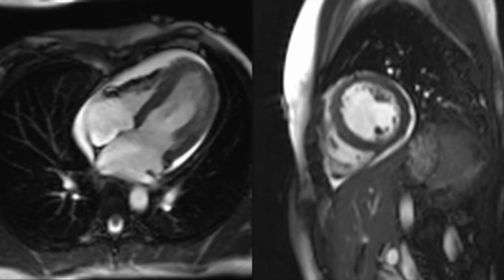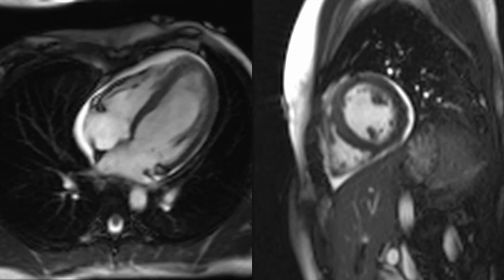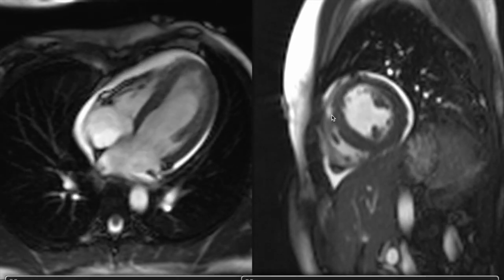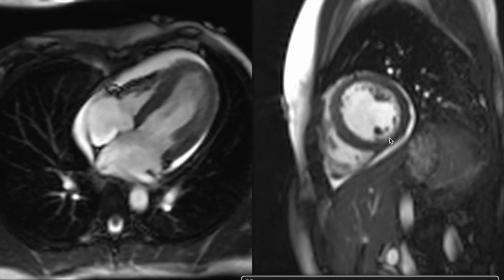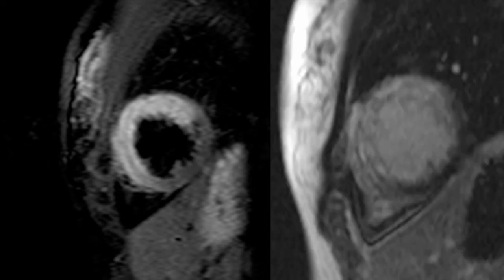This patient came into the emergency department with acute chest pain, a young female patient, and on MR, what we are looking at are areas of hypokinesis along the anterior segment. There is mild pericardial effusion also seen in this. And when we do edema imaging, this is clearly showing us an area of inflammation in a large anterior wall, while the inferior wall seems to be normal. Delayed enhancement imaging demonstrated diffuse transmural enhancement of the anterior wall, suggestive of a large non-viable territory of infarction.